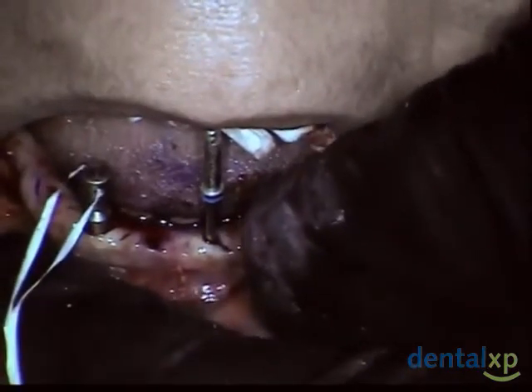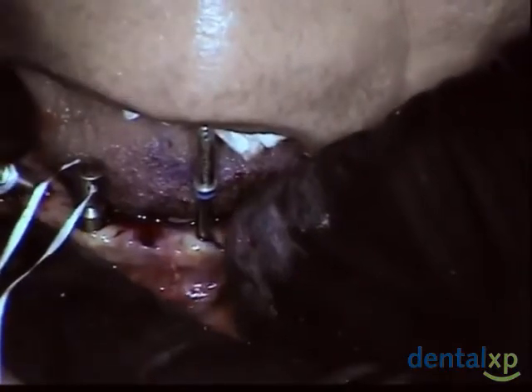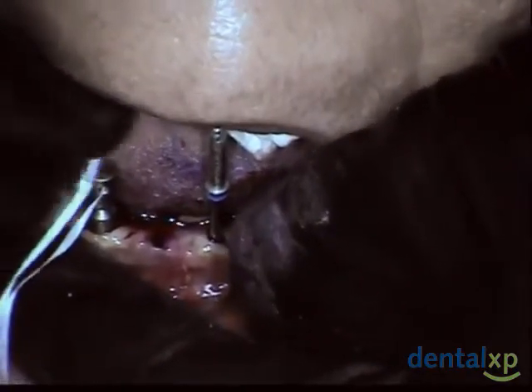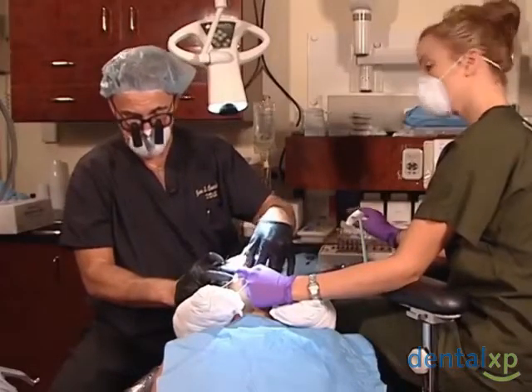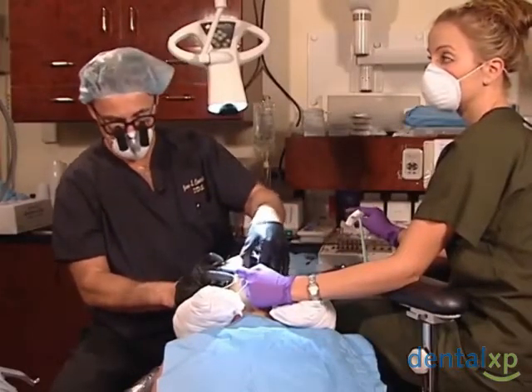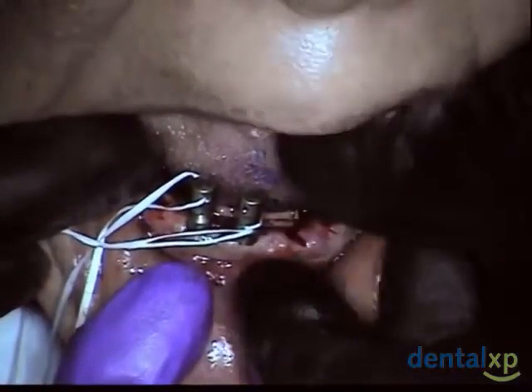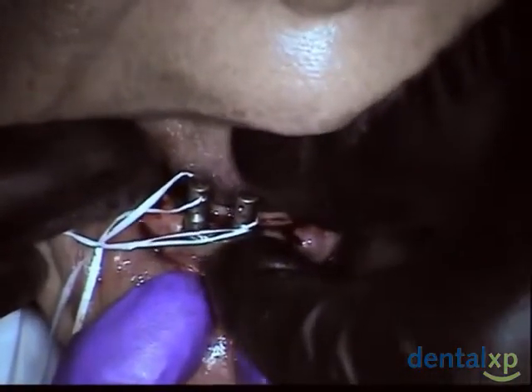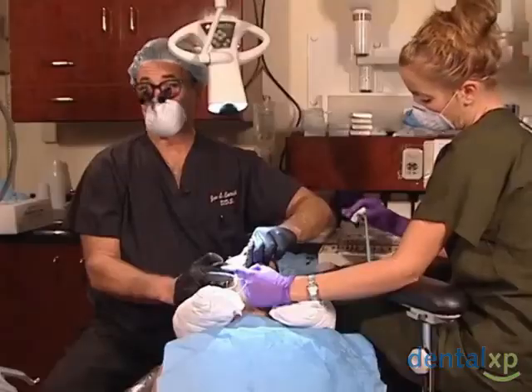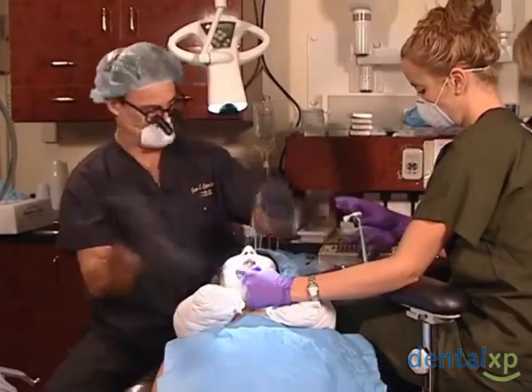it parallel, or you have the option, as I said earlier, to go with an angle-corrected implant, and it's no big deal to place a 5-degree correction in there. I would say if you have to study it, it's most likely within that 5 to 8 degree range that it's not going to be a problem. If you ever place a 5-degree correction in the mannequin, it's easily seen that they aren't parallel. So again, you don't have to spend 20 minutes deciding, am I there or not? If you can't determine that with a quick look, then most likely you're within that range.